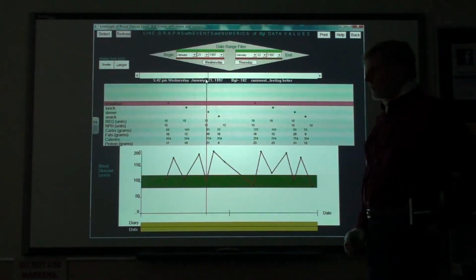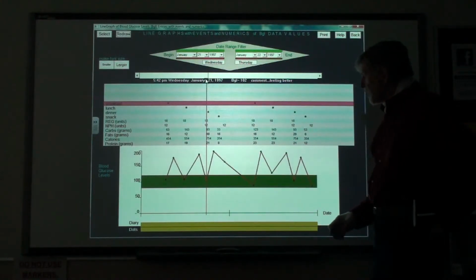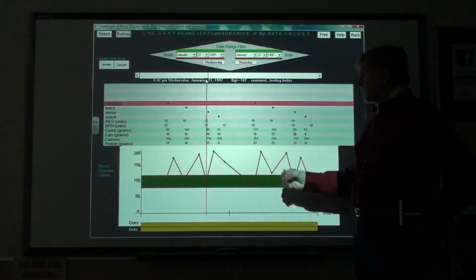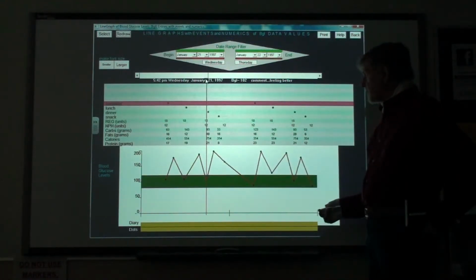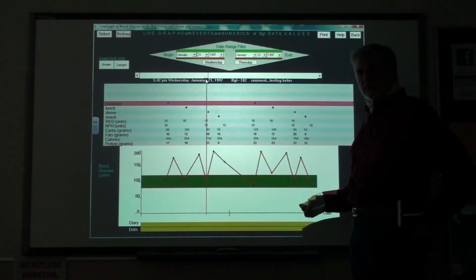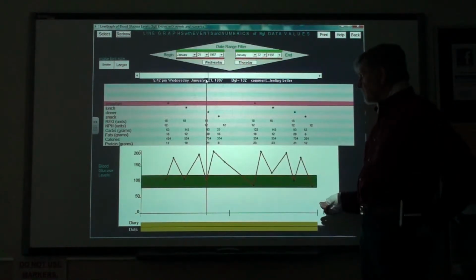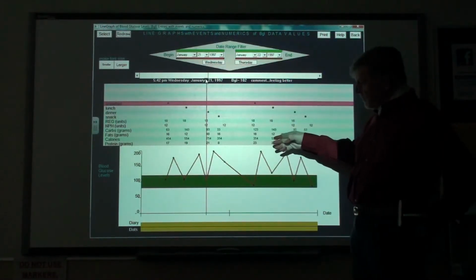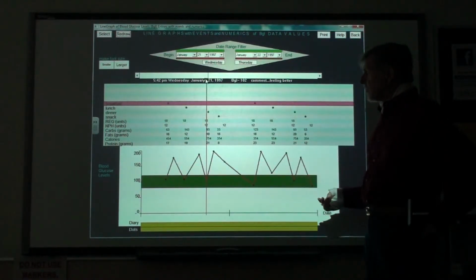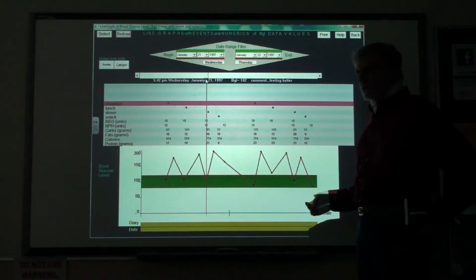And as soon as the effect of the meal wears off, the long-term insulin is taking the readings back to the target zone. But when they come up to the next meal, then the calories and protein, carbs, and fats are ingested, along with the short-term insulin, whose job is to keep the effects of the meal down, and the short-term insulin is failing to keep the effect of the meal down. And so, only until the meal is ingested does the reading go back down. So the conclusion here is that the long-term insulin dosage is fine and the short-term is insufficient.